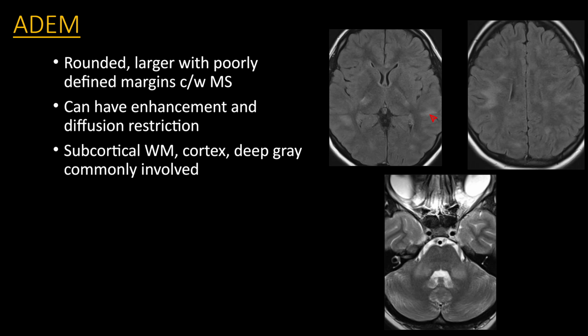Here's another case of ADEM that I have. You can see ill-defined involvement of the thalami, the internal capsules, and some subcortical white matter involvement that's again pretty ill-defined, unlike what you see in MS. In MS, you don't typically see these more confluent-appearing lesions as you see in this ADEM. And here are some lesions involving the middle cerebellar peduncles on both sides. So again, the lesions tend to be more ill-defined.